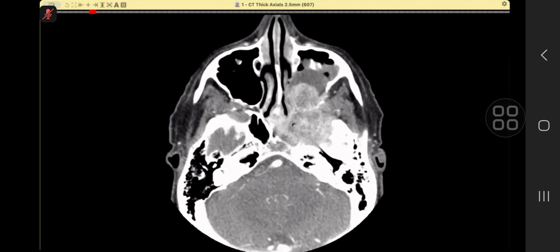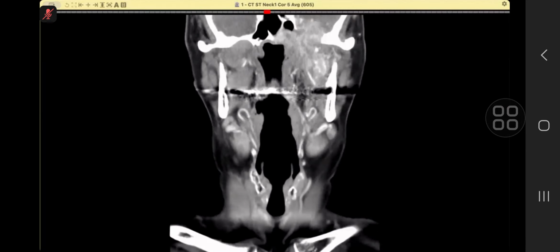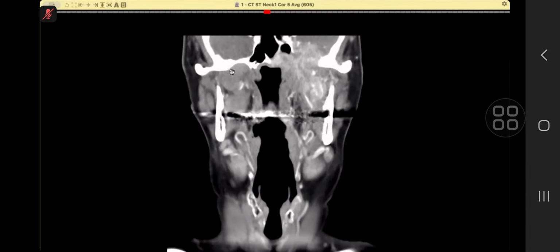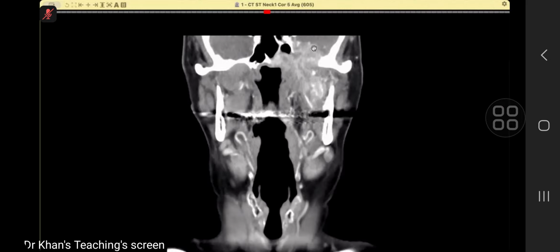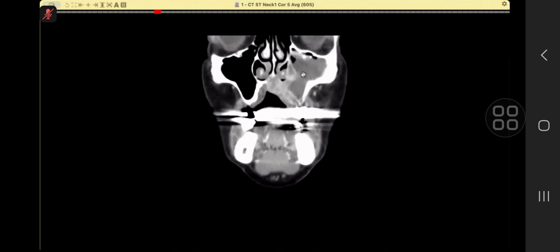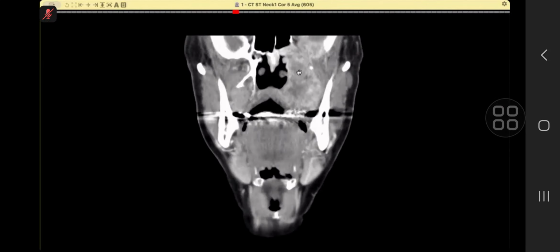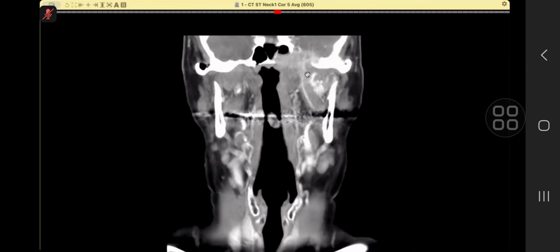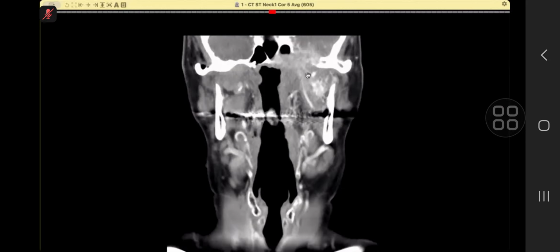Of course, it has gone into this coronal. Even here, actually at the edge, we can see it. So it is going into the cranial cavity. So here you are. So this was picked up, which was fine. But posteriorly, the whole of this exercise is about what else is involved, things like that. Okay, overall you did well.